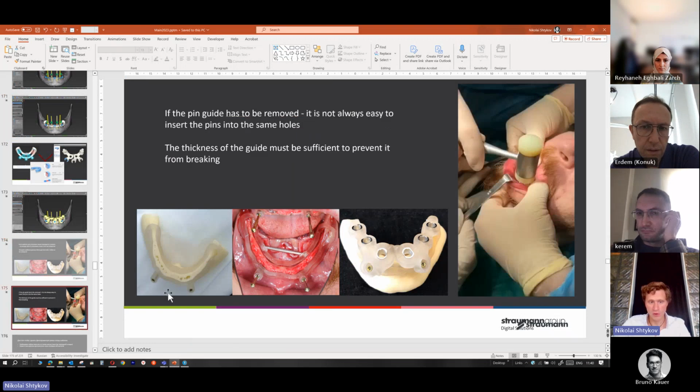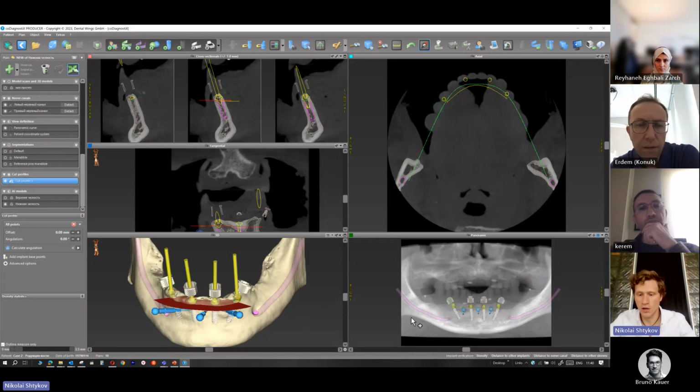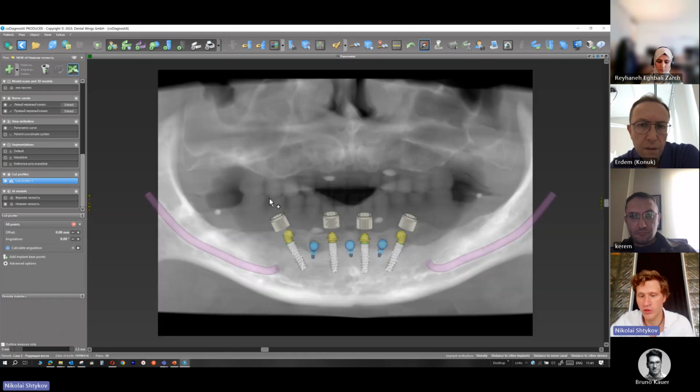Because on here you see. And how to make it, to add the point. I can't add the point to the gray area because there are no regions to place the points. That was a mistake. I open the panoramic curve and place the points on the panoramic curve.